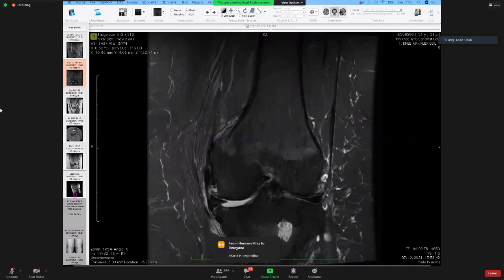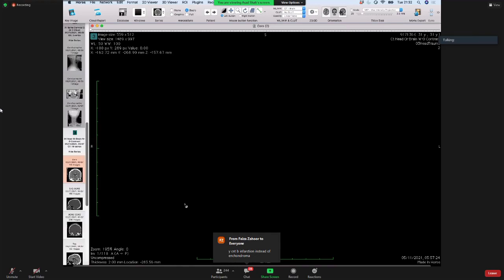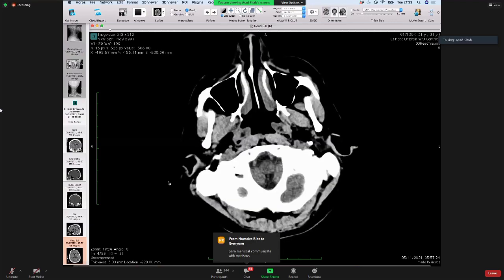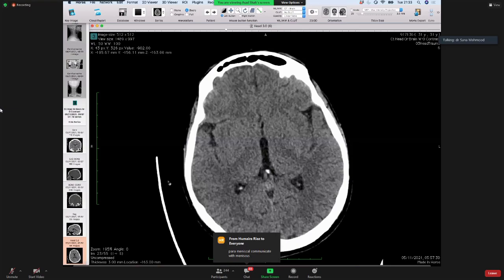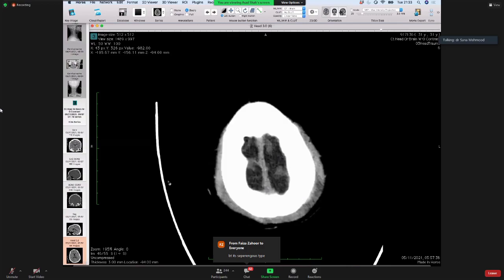So I'm going to show you this case from ER. This is a 31-year-old lady who had a fall. Okay, and just to change the scene, I'm going to show you the CT, right? So non-contrast CT head. Sir, these are axial CT images, brain. I can appreciate that this is a plain study, and I can appreciate that there is diffuse soft tissue thickening around the scalp with air, suggestive of traumatic injury.